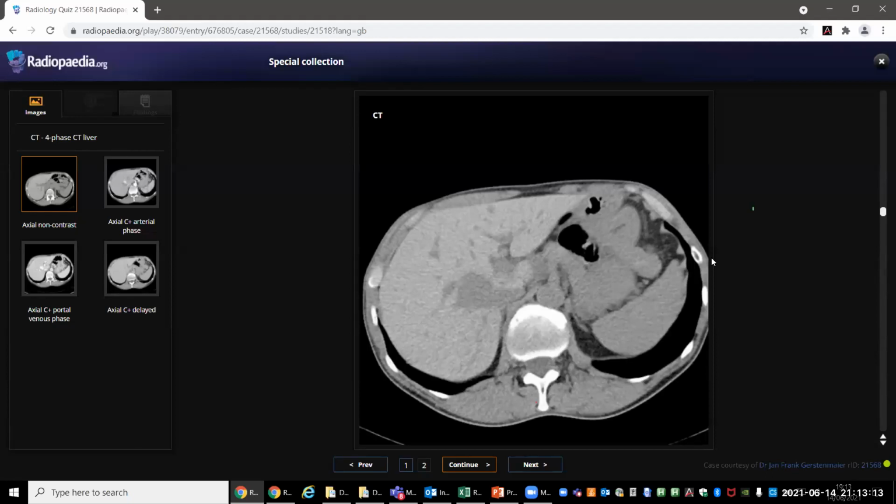I would like to measure the attenuation value of the liver. And this could be related to any history of drugs which the patient might be taking for a cardiac ailment, like an iodine-containing heart failure drug. You can't remember the name. Amiodarone. Okay. Or it could be related to some disease like hemochromatosis, which can contribute to the hyperdensity of the liver, ma'am.